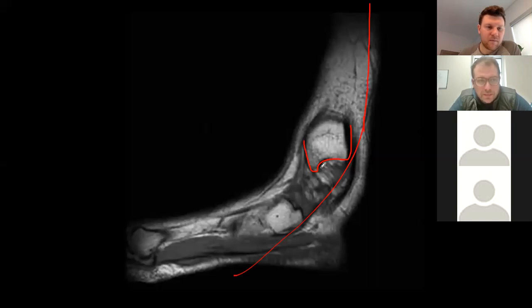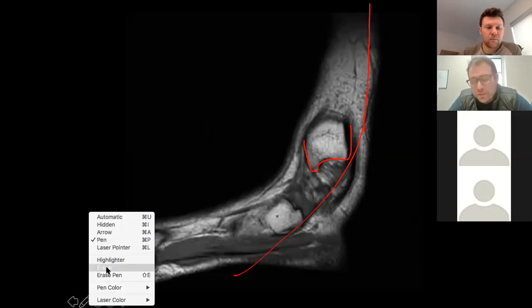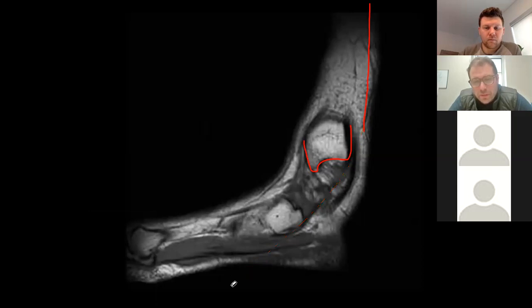So we're looking medially. So when we looked at this with the x-rays, the anterior and posterior colliculus are important when looking at MRIs or CT scans to see where that fracture is. In the case of a medial malleolus fracture, where the fracture is determines where you place your incision for fixing it.